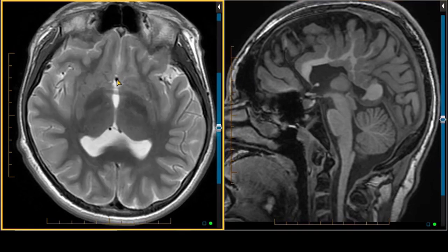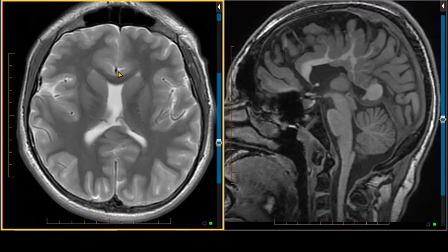We still see what's an azygous or unpaired anterior cerebral artery and midline continuity of the telencephalon, but we're not seeing all the other features that would make this a true prosencephalic abnormality. So syntelencephaly is an even milder hemispheric cleavage abnormality than lobar holoprosencephaly.